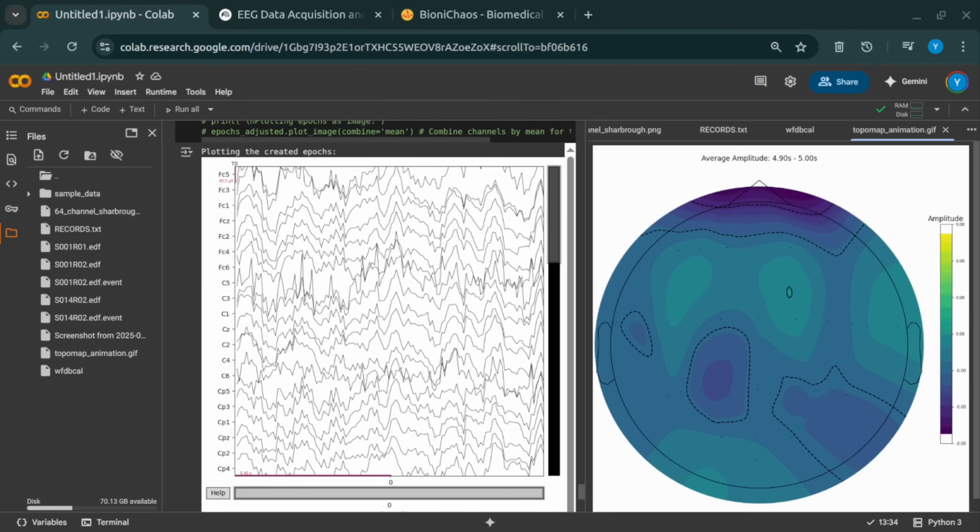So let's kick things off right at the beginning. We've got this raw EEG data, but it's certainly not a ready-made masterpiece just waiting to be admired, is it? Not at all. Before you even dream of seeing those beautiful brain maps, what are the very first, foundational hurdles you hit when trying to transform that raw signal into something meaningful, like a topo map, that colorful map of activity across the scalp? There's a definite and often challenging journey from those raw, noisy signals to a coherent, interpretable image.